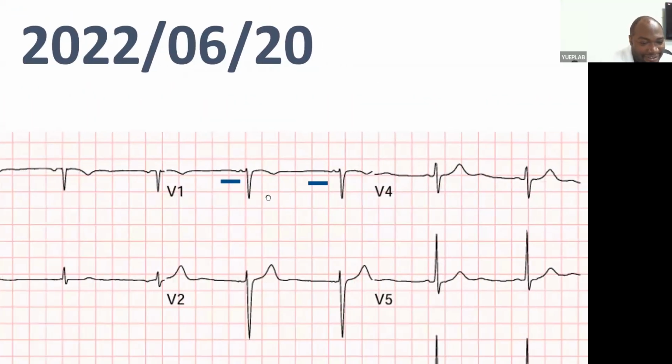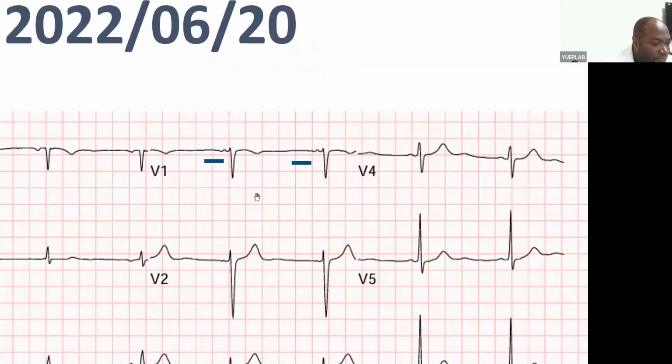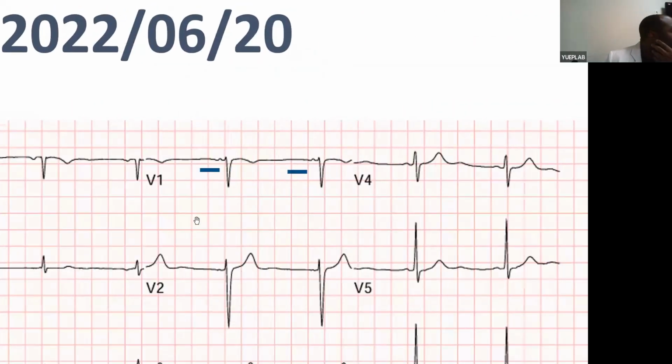But on the 12-lead EKG, this patient has a baseline trend of cardiomyopathy. Look at the recorded voltages versus limb leads, the low voltage. And if you look at the echo, the patient has dominant biatrial enlargement with preserved ejection fraction. So you start wondering what the basic true mechanism is, probably restrictive cardiomyopathy in this patient. She's a female. You need to look at that first, because that is probably what helps the patient more than the pacemaker and all this business. If there's a restriction, you've got to deal with that.